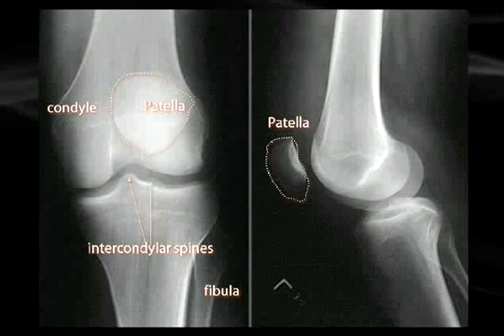You can see the intercondylar spines. These intercondylar spines, or the intercondylar eminence, will serve as attachment points for the menisci, and then on the edges of each of those you'll have the attachments of the cruciate ligaments. Notice the nice gap that's between the two condyles. If that one is lower than the other, that could be a Q angle problem, or it can be a meniscal problem where one is wearing away. Arthritic indications will come into being with that line between the two. And of course the presentation that the patient comes to you with.